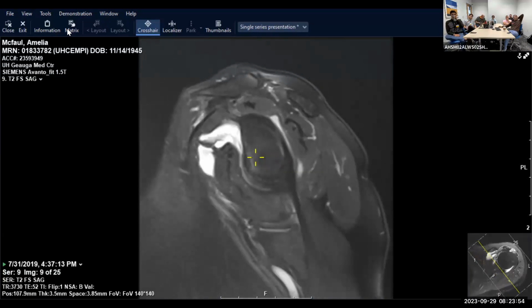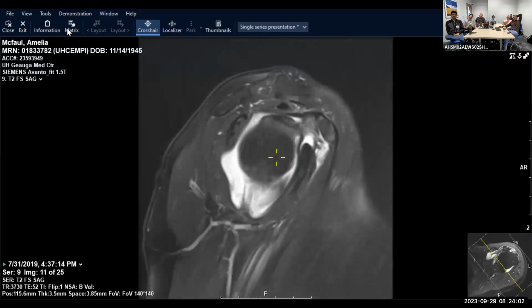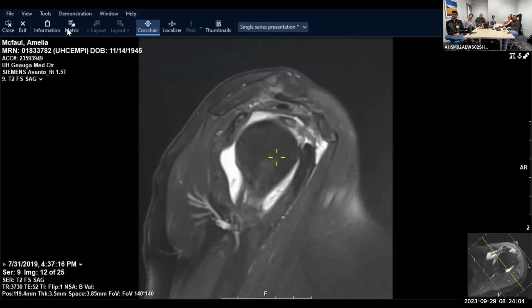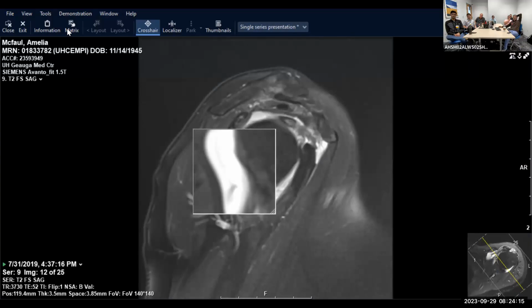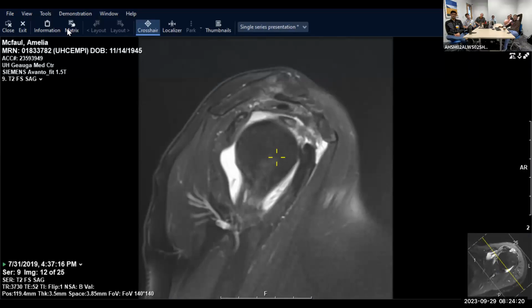And basically right around here, the posterior superior aspect, so let's say if we were like this, it would be the 10 o'clock position, 11 to 10. And you're gonna see a structure come off here, it's this, and see there's signal within it. Technically speaking, if it's intermediate signal intensity like this, you see the difference between this and this, right? This is much more bright, and for a cuff tear, it's gotta be this signal intensity. You have to have fluid filling the gap, or markedly abnormal morphology where you can tell that the fibers aren't making it. Otherwise, it's just tendinosis.